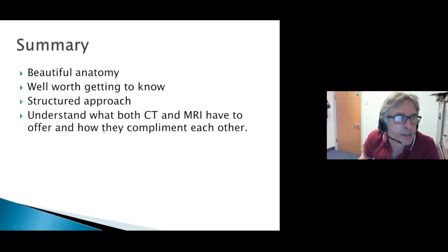We do also need to understand what both CT and MR have to offer. They do run independent to one another in some situations, but they also complement each other as well.